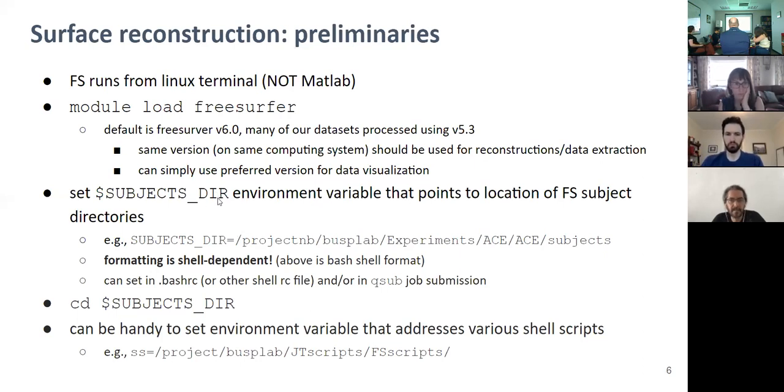And what you can do is, at one time, what I would have said is just put it in your RC file. Are we all familiar now with our RC files that are in our home directories on SCC? They're system files, so they start with a dot, so they're hidden. Dot bashrc. Bash is a certain kind of shell. Think of it as like a programming language that you use at the terminal to interact with the system. There are different versions of this. By default, I've been using bash.